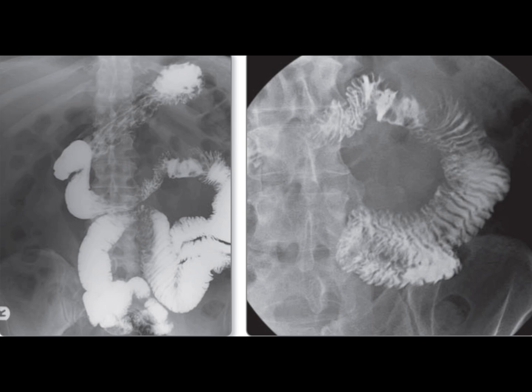The differential diagnosis for an apparently solitary mucosal-based lesion in the small bowel is broad, including both malignant and benign etiologies. These can range from adenocarcinoma and carcinoid tumor to benign conditions like adenoma, hemangioma, and lipoma, as well as inflammatory pathologies associated with connective tissue diseases or previous radiotherapy treatment.